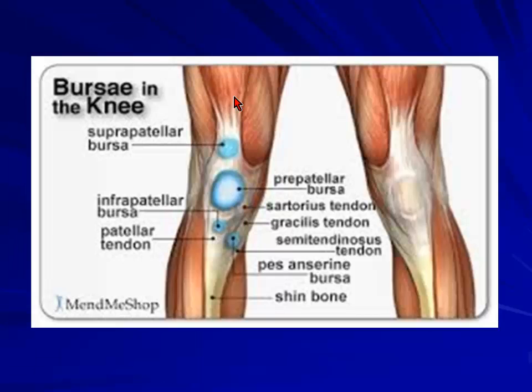So this is what I was saying. You have got rectus femoris, vastus medialis, vastus lateralis, and this forms a retinaculum, and this forms the superior patella tendon, and this is the infrapatellar tendon, and this basically is attached to the tibial tuberosity. You can have an avulsion injury involving the superior pole of the patella. Normally it doesn't evolve from here, it evolves from the tibial tuberosity.